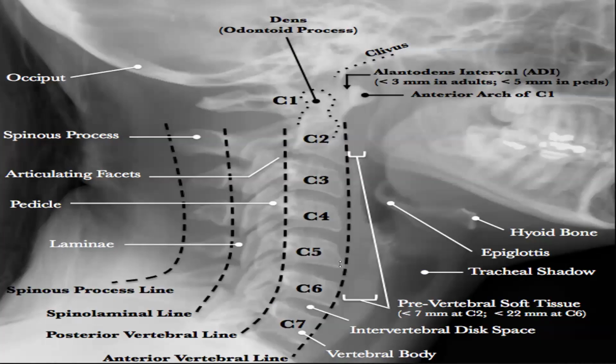It means you should check the soft tissue here and the soft tissue here. Any problem, like any radiolucent color, any opacity color, and you will check the size also. So the normal size, you can check at C2 and C6. At C2, this area, some sources say C3, same, no problem, because C2 and C3 are almost the same, okay?